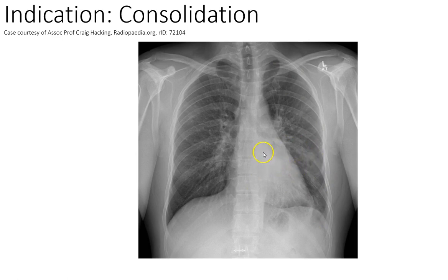So consolidation in this X-ray image, I would probably, just because of this air bronchogram, predominantly treat that left lingular type area, just because of this stretching all the way out here. I think that's probably my area of a little bit of consolidation in there.